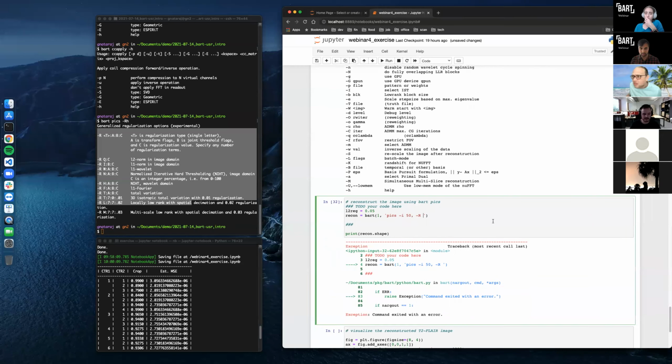We didn't finish the command yet. Q, and Q gets 1 argument, so we'll have to specify that. And then are we done? Do we need to specify any other flags? We can, but it's not necessary. Okay.